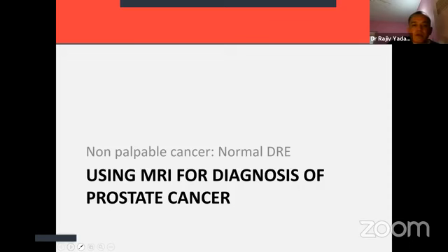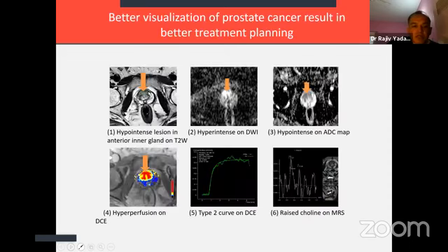Here, this is a contrast enhanced image, this is a diffusion weighted image, this is an ADC map, and this is the conventional T2 weighted image. Although here we have done all the sequences, as we discussed earlier, if we just get a non-contrast MRI, meaning thereby this sequence, this sequence and this sequence, these are part of the biparametric MRI. The top line is biparametric MRI. These by themselves are sufficient to make the right diagnosis.